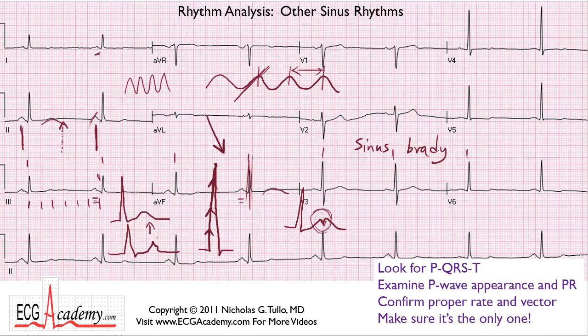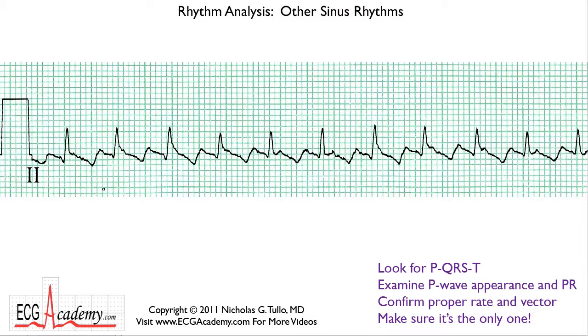All right, so we'll do one more example here. Now this is off a 12 lead, so we know it's definitely lead 2. So here again we have a situation where the QRS complexes are easy to see. They look to be fairly regular. They march on through. And where's the rate? Let's find a QRS that lands close to a heavy line, right about here. And we'll measure off 300, and it would be 150 if it's here, but it's faster than that, isn't it? It's less than 2 big boxes. It's probably about 152 beats per minute.